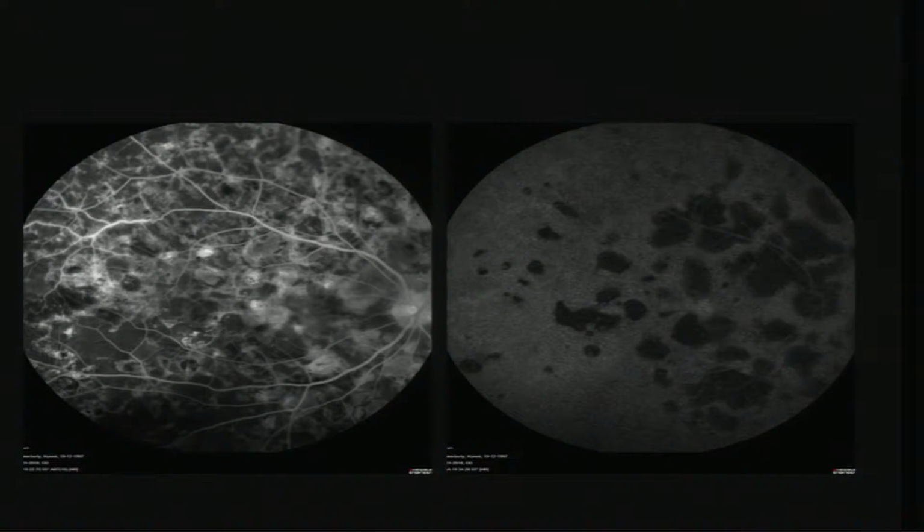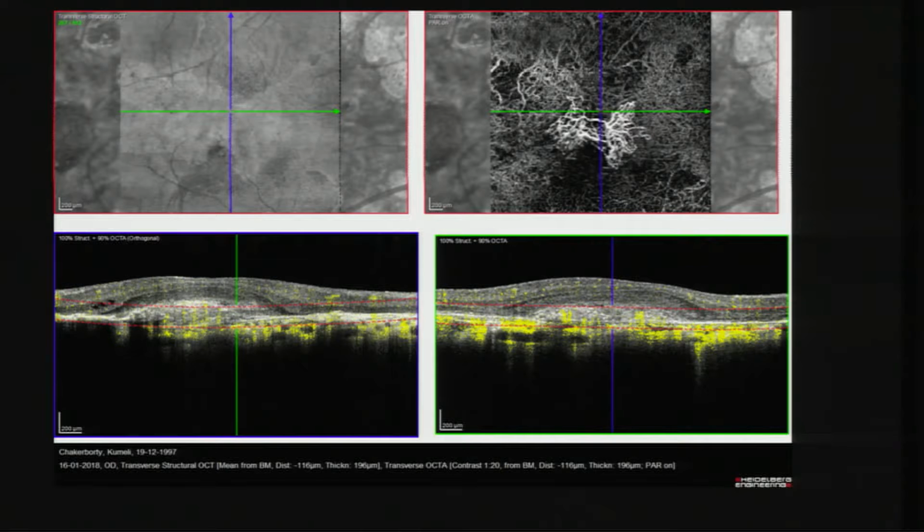Now the question is, there is a lot of choroiditis which is healed. There is complaint of recent metamorphopsia. You are in doubt based on the OCT image. You're not too sure whether it is a membrane or not a membrane. Would you inject or would you not inject? This is where the OCT Angio helps you in making a clear-cut decision.